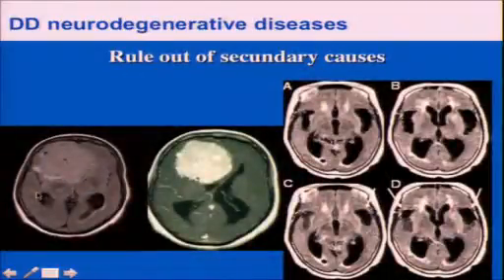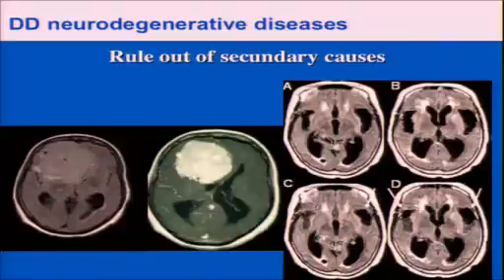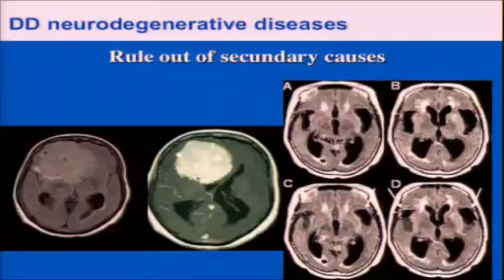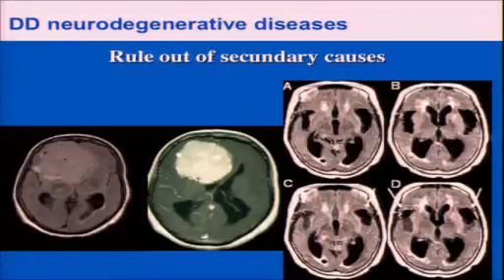So, a couple of secondary causes. Here you see two patients. They were both admitted to the Center for Mental Health with dementing symptoms. So they developed a dementia and came into the psychiatry hospital. That's where most of the patients had their workup, at least at our site and also here. And we found, of course, some treatable causes, like this one patient who had a large frontal tumor. It turned out to be a meningioma, was resected successfully, and the dementia completely resolved in that patient.